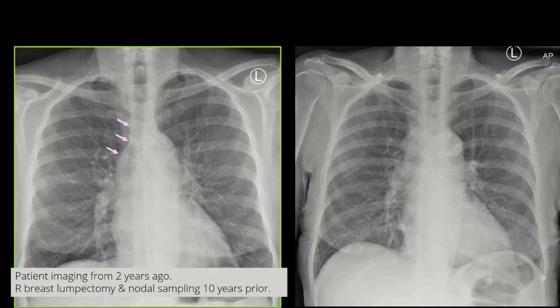What is this line indicated in pink? It is the paratracheal stripe. It is where the right lung pleura abuts up against the trachea, forming a line. The lower portion is the azygous arch.